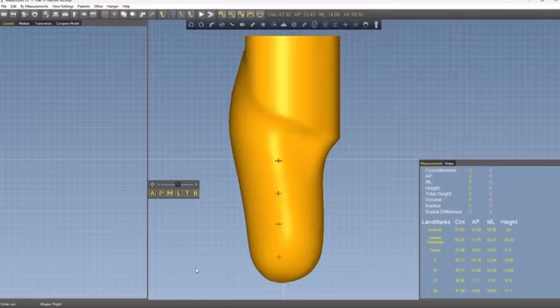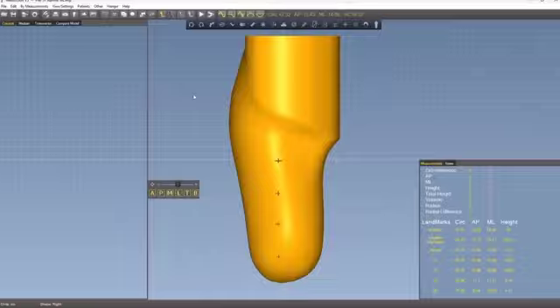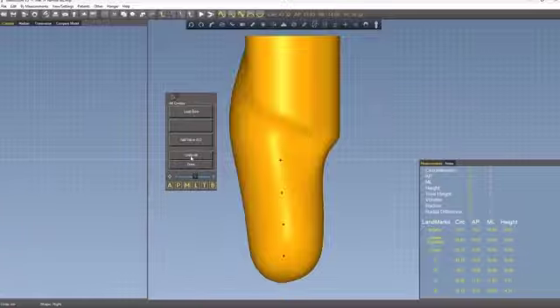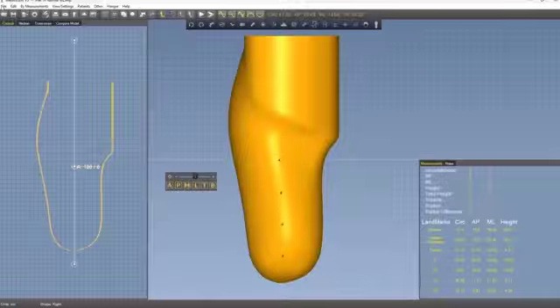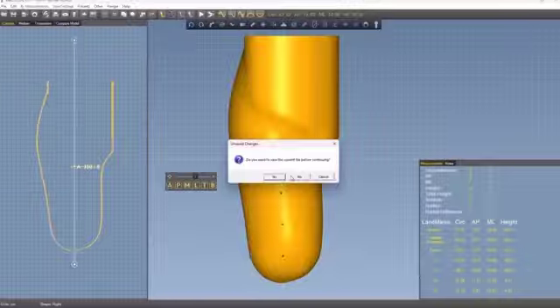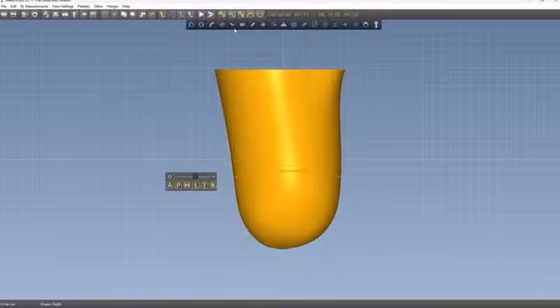Here's something a little more fancy, also involving templates, where you could use the AK create option, where you scan the bottom of the distal end, or you captured the bottom of the distal end of the AK. You then go to the AK create, AK builder, and you say OK. So sorry, let me just load a distal end first. Okay, so we have a distal end loaded.